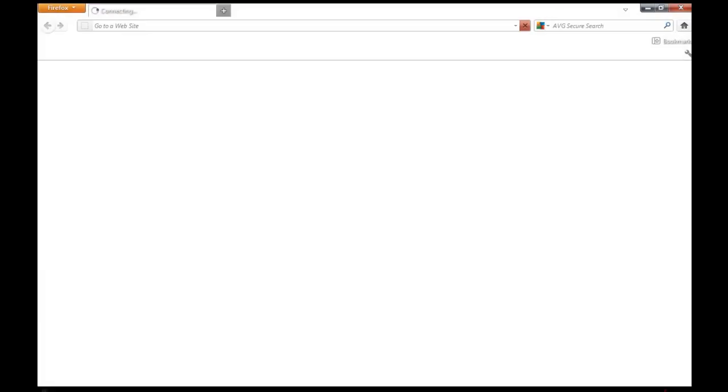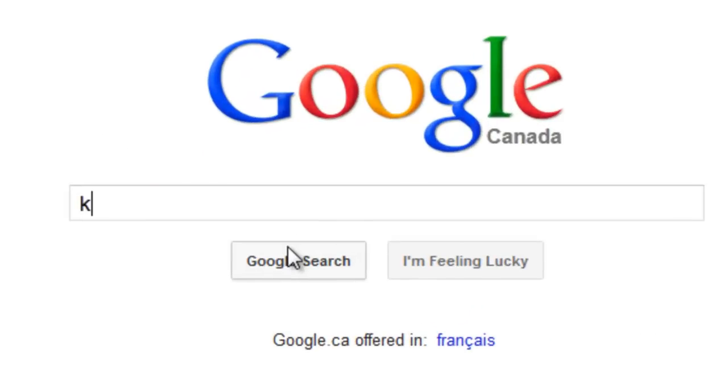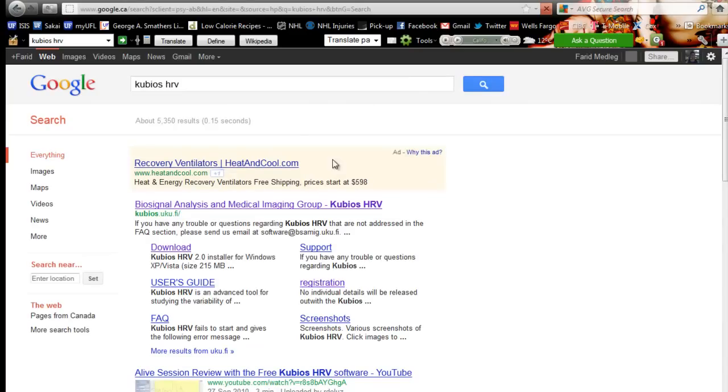Okay, so the next part of the lab is going to be the actual analysis of the data. To do that, we're going to need to get a piece of software. It's called Kubios. So first you're going to open up a browser. It's very easy. Their URL doesn't work very well, so just head over to Google. Type in Kubios HRV, and the first link in the results page should be what we're looking for. Yep, right there, biosignal analysis.